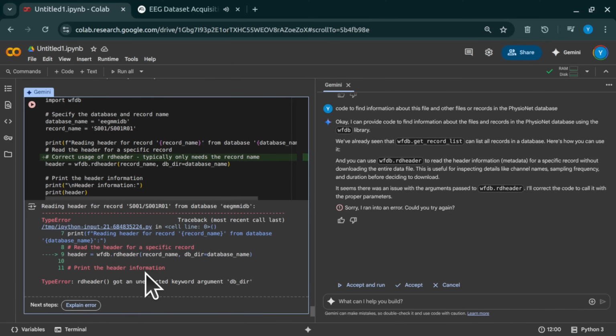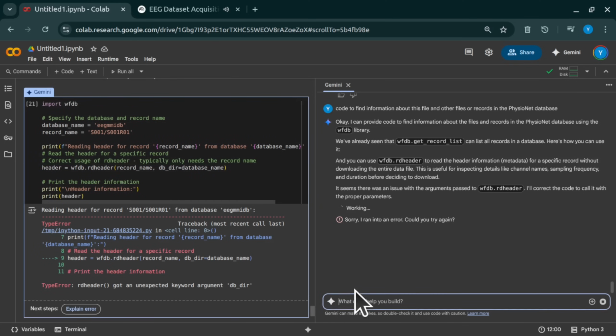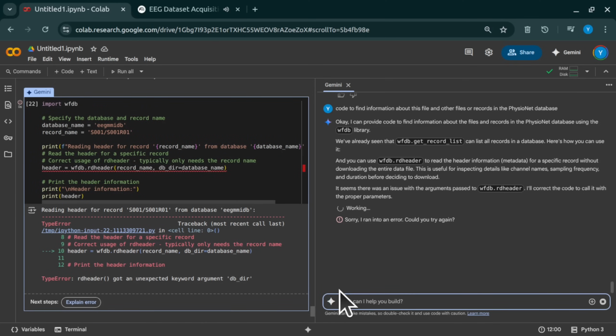And what about how fast it was recording? That's the sampling frequency. It was 160 hertz. So 160 data points every single second for each of those 64 channels. Wow, okay. 160 snapshots a second. That's pretty fast. Why so fast?